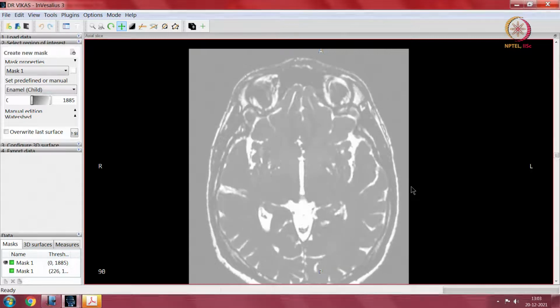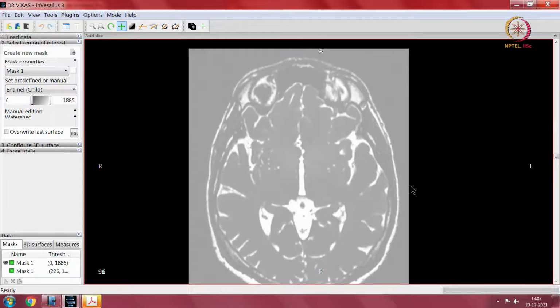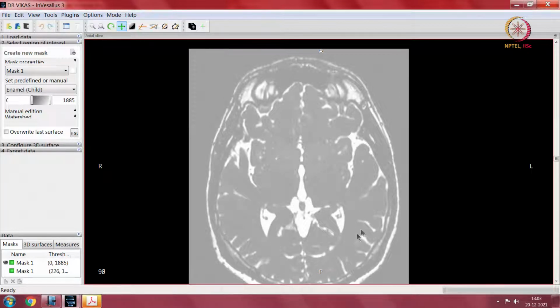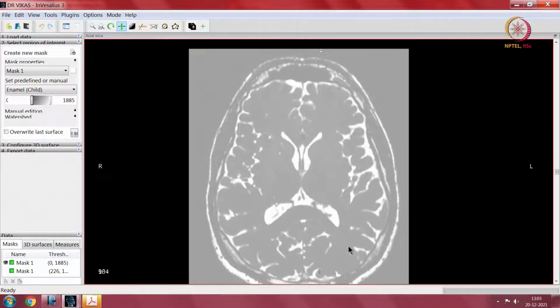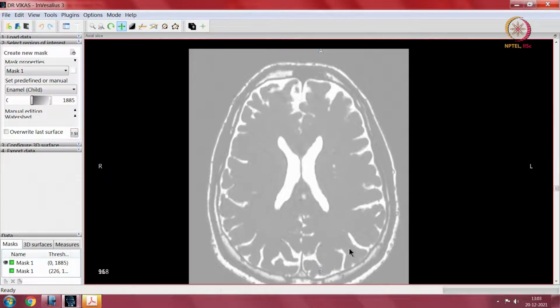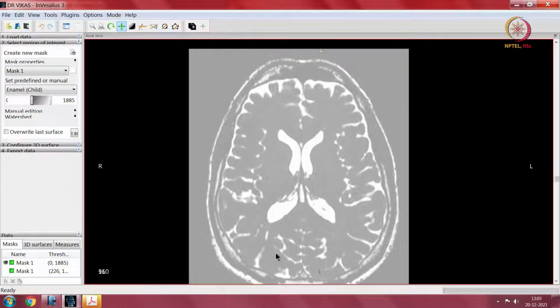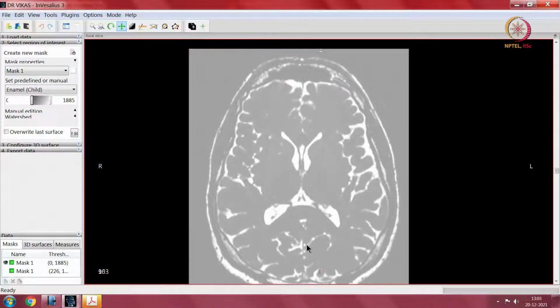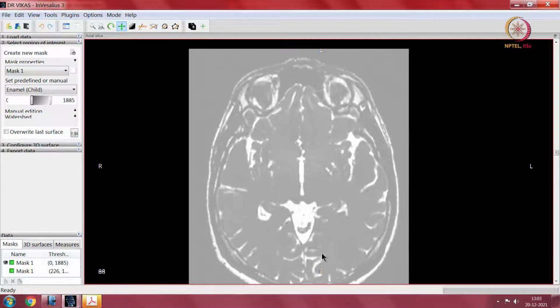So, posteriorly, how do I find out? Yeah. So, there is this one sulcus which is coming over here, and that should be the calcarine sulcus, which is where the visual cortex is located. Where is the calcarine sulcus? So, calcarine sulcus should be this one. Fairly deep, it is deep. So, all important sulci are pretty deep, that is a way to remember things.